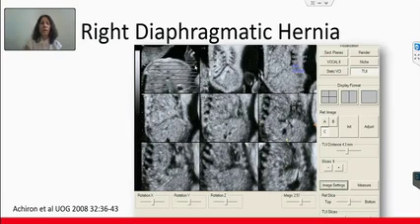You go slightly back to this image. So this image is this line. Now go to the second line, this image. You can see the lung, you can see the liver, you can see the diaphragm here. Then you go more posterior, you can see the lung, liver, the diaphragm, but here you're not sure what you see. So when you go back and back, you see that the liver just entered the thoracic cavity.